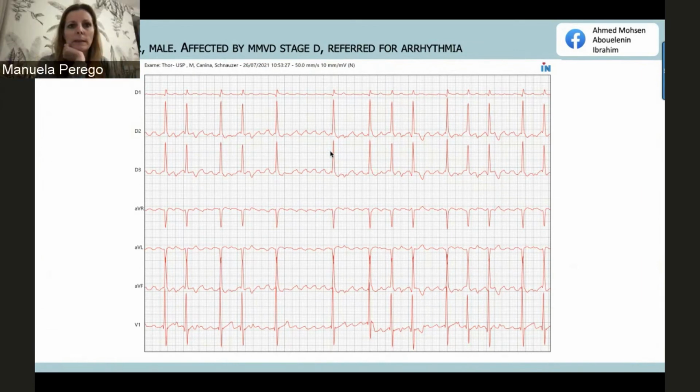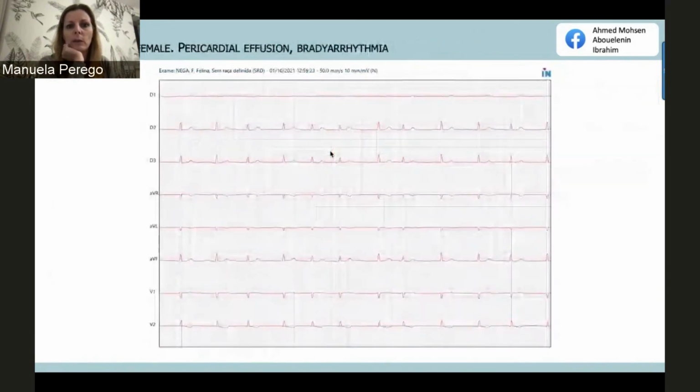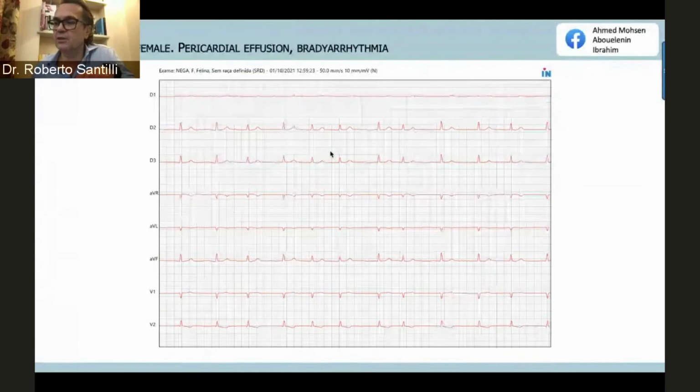Okay, thank you very much. We have some 9 minutes just to have a look at the last ECG. Okay, so maybe we can go fast in this one to finish the one of this colleague.